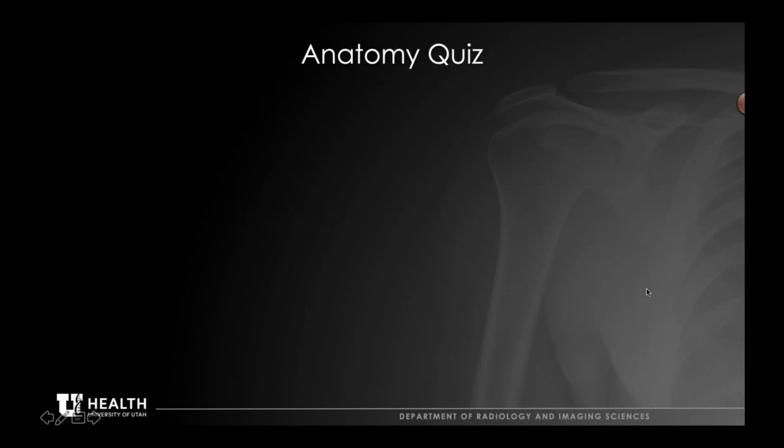So first of all, we're going to do an anatomy quiz. This is not like your official quiz. This is just a quiz, so we can test your anatomy. So write this down, whether it's on a piece of paper or on your just typing it out or whatever the case is. Like I said, if you understand the anatomy and you know the anatomy well, identifying an injury and kind of diagnosis becomes much easier. So we'll start with the muscles and tendons. So it's a little hint here, muscles and tendons only. And there's a lot of these, so I'm going to go through them pretty quickly.